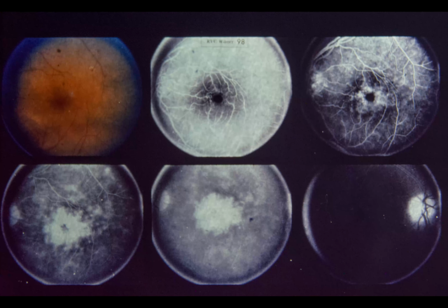Slide 98. Quiz slide number 4. This 40-year-old white female has noted blurred vision in both eyes for several months. She has no systemic disease. Visual acuity was 20/20 right eye and 20/40 left eye. The anterior segments were unremarkable, but there were vitreous cells bilaterally. The right fundus was normal by direct ophthalmoscopy. Upper left is a photograph of the left macula. Fluorescein photographs of the left macula are seen as follows.